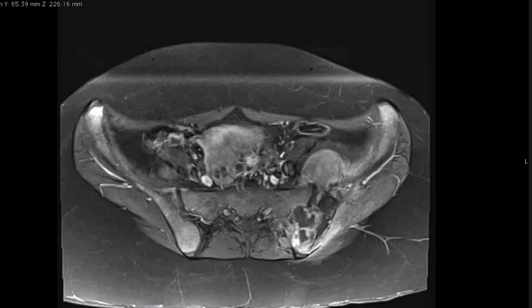So what's the next step? If you diagnose it as Ewing's, how will you proceed then? So next, there must be some histological correlation, and then staging CT chest. Sir, CT brain? Why CT brain? No, sir, actually I was confusing it. You can't CT brain every child who's got Ewing's. CT chest, sir. Yeah, CT chest is good.